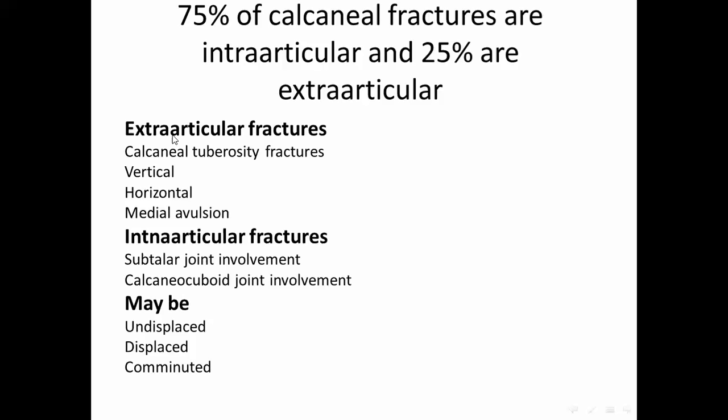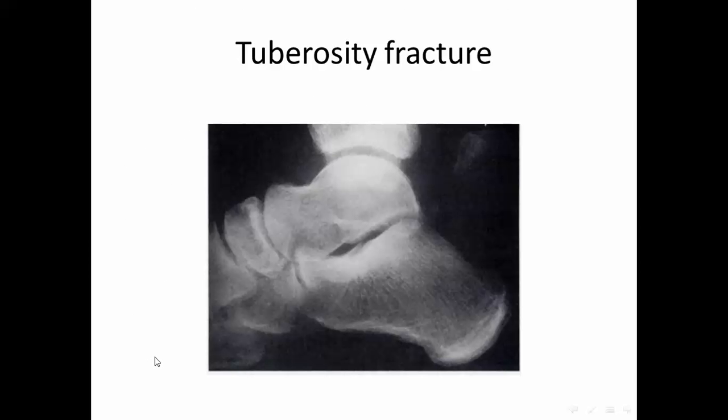Extra-articular fractures could involve the tuberosity, whether vertical, horizontal or avulsion, and may be undisplaced, displaced, or comminuted. This is a tuberosity fracture.